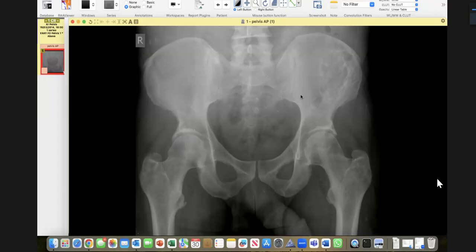Having said that, my main emphasis was here. This is a 53-year-old who has got a lytic type of lesion with marginal sclerosis. Now, this is thick marginal sclerosis. You asked for a CT, but actually the role as far as characterization of bone tumors is concerned in your FRCR exam is MR. And CT, of course, in osteoid osteoma, you can ask for a CT for nidus, etc.